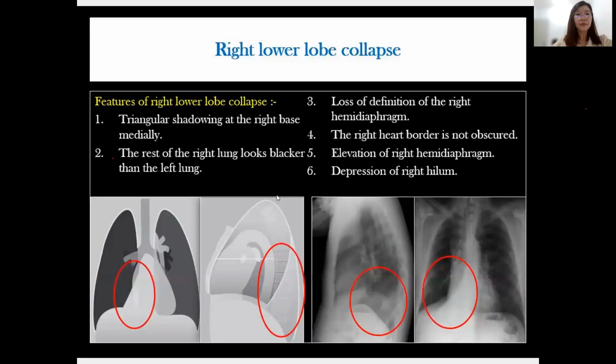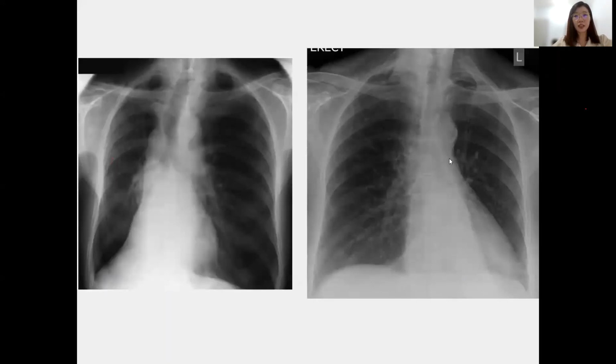All right. So now, what about this? Okay, this is the next X-ray now. Anyone? Everybody is doing very well. They're paying attention.